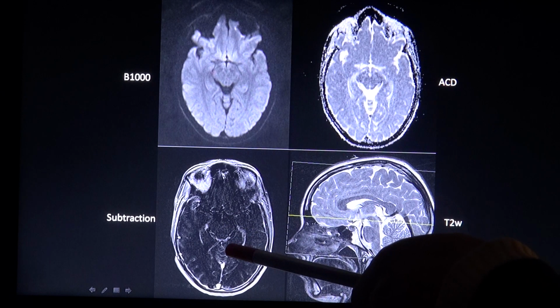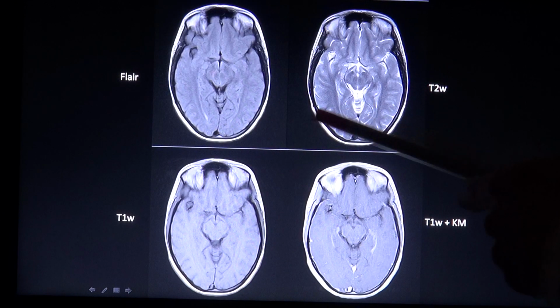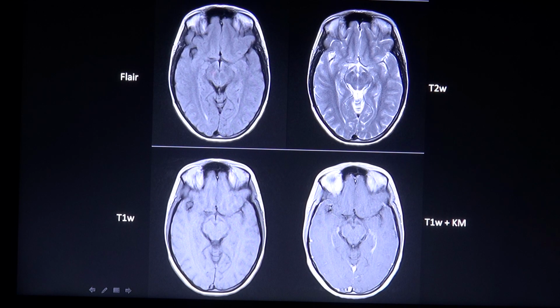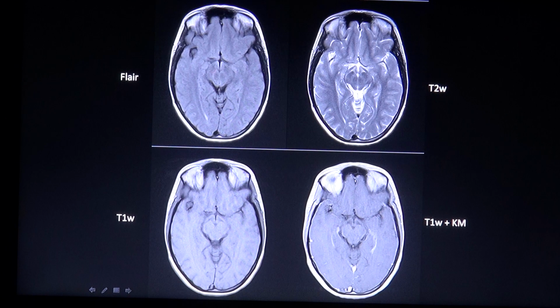As already mentioned, the most important feature that differentiates a T2 image from a T1 is that water appears bright, as seen here with the cerebrospinal fluid. What else appears bright on T2? This would be a hyperacute or late subacute hemorrhage, an edema, as well as most pathologic lesions. Also, fat appears bright, so if you see a structure that is bright on both T2 as well as T1, you can tell that it is either a fat-containing lesion or a late subacute hemorrhage.